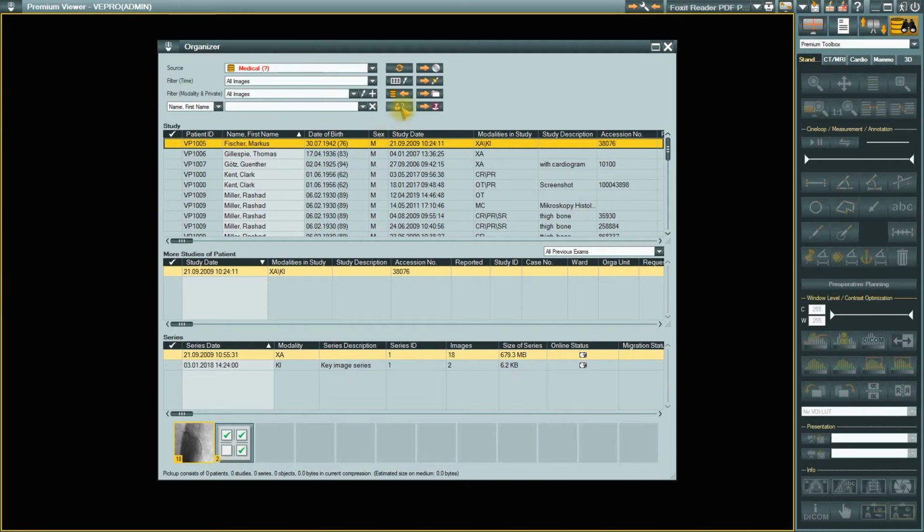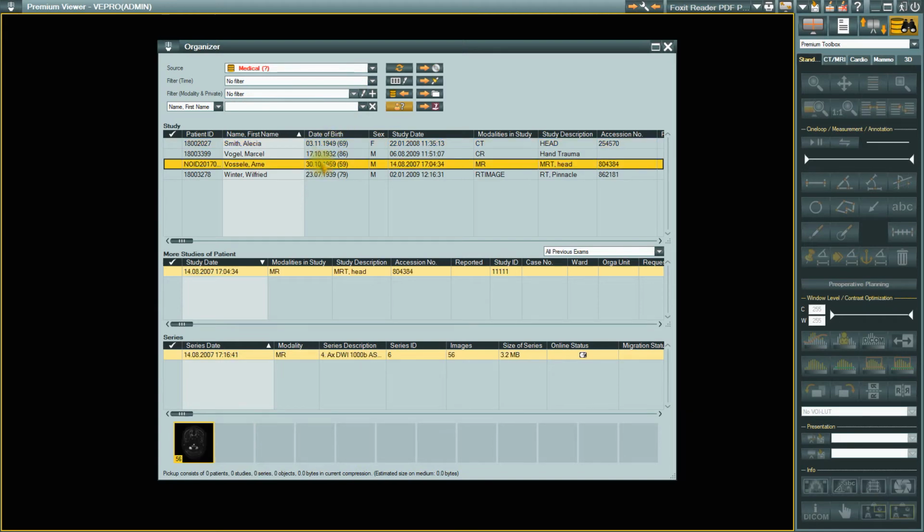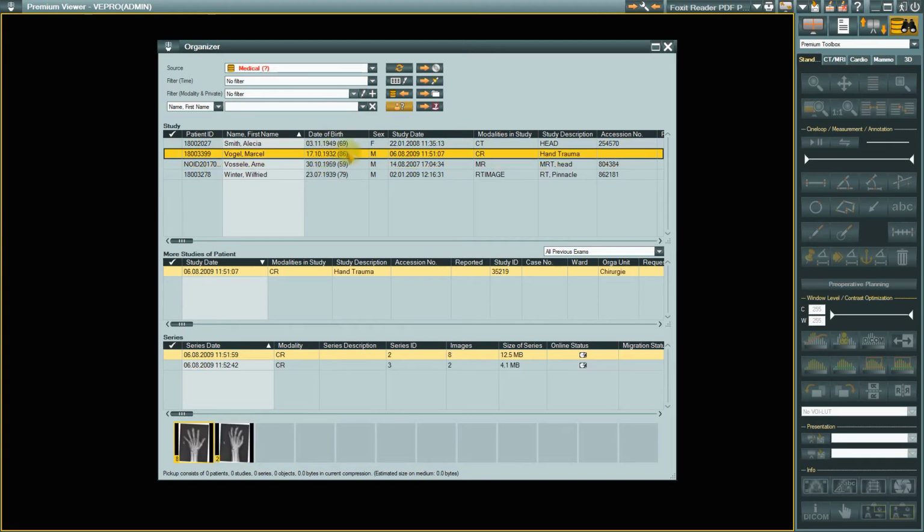So, by clicking the following button, let's switch to view the inconsistent data. After switching, the button remains enabled. Only the custom filters are available for the Discrepancy Archive. To correct incorrect patient demographic data and transfer it to the medical archive, you need to proceed as follows. Select the data record that you want to edit and click the Edit button.